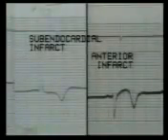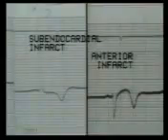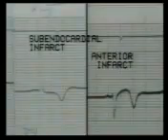At this stage, let us remember the picture of anteroseptal infarct, where the ST segment is elevated and T wave is inverted. Compare here on the left ST depression in subendocardial infarct, and on the right ST elevation in anteroseptal infarct, both with inverted T waves.